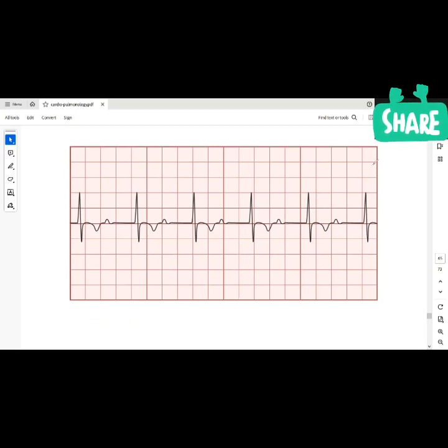All right, now let's try this one. Same thing. Let's start. Would you read this ECG for me, please?